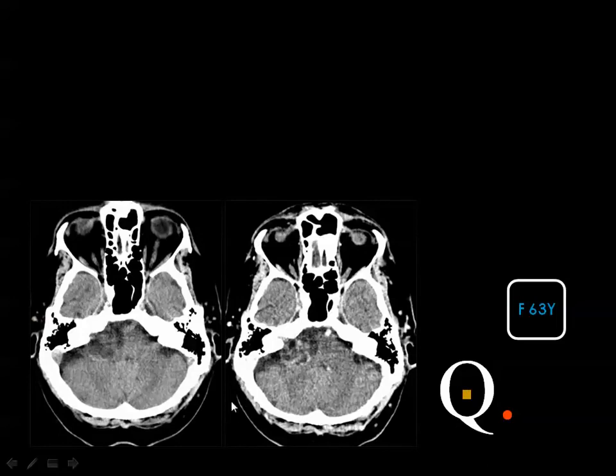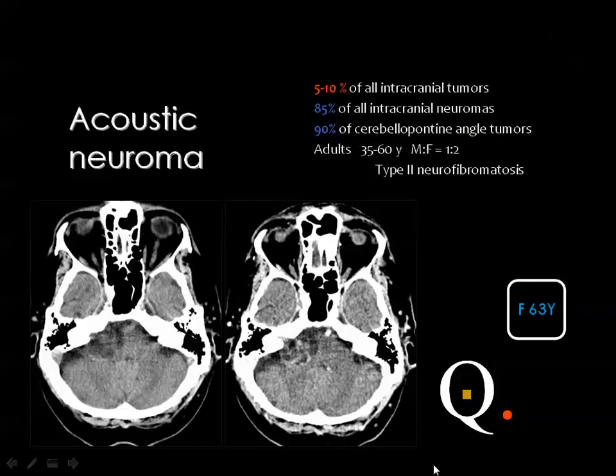CT scan of the brain before and after contrast. Yes, and this is cystic acoustic schwannoma, because there is enhancement, and the tumor is centered to the orifice of the internal auditory canal, and the ipsilateral cerebellopontine angle cistern is wide, denoting that this is an extraaxial pathology.